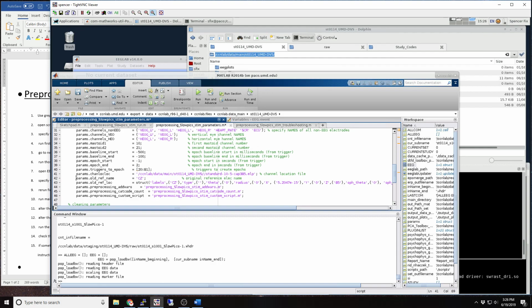these two here. Oftentimes montages have a reference channel embedded in the physical montage, so an electrode that all the other electrodes are referenced to. And so when you collect data, that's sort of what it references by default. And for this montage, it references CZ. Now, as I said earlier, we're going to re-reference to the linked mastoids. So we're going to want to reclaim this electrode.